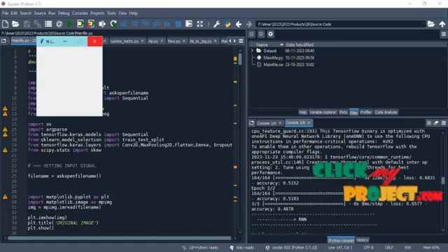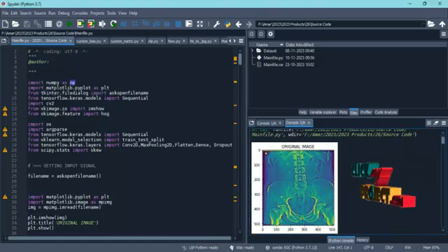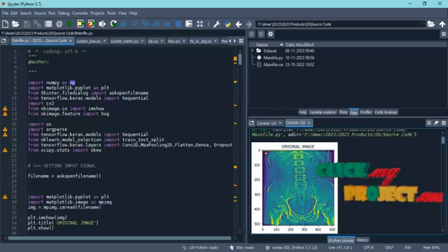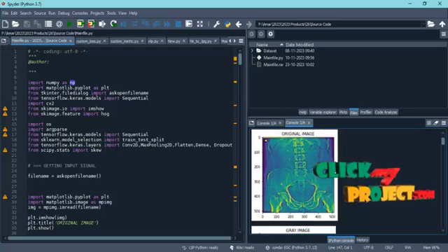Now the process has executed completely. We can see the results one by one. This is the original image which we have imported from the dataset. The user can select not only kidney images, but any images like kidney images, brain images, or mammogram images. We have to select any one image from the dataset. After the selection, the corresponding image will be shown in this console like this.